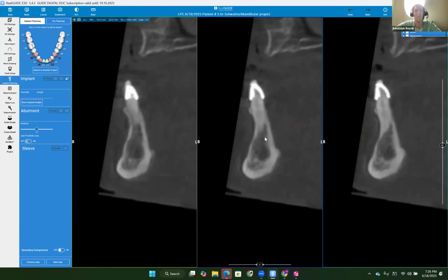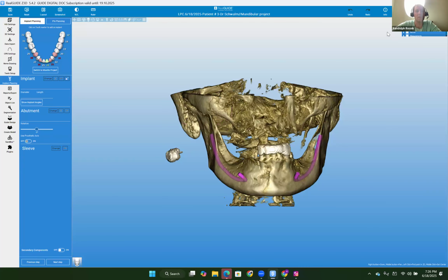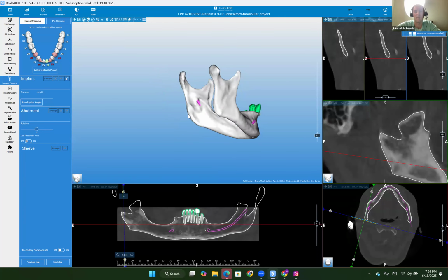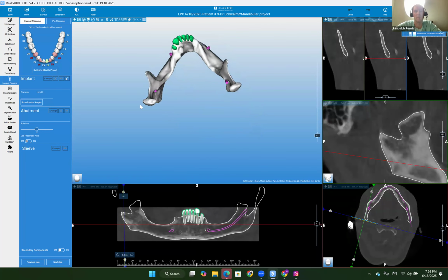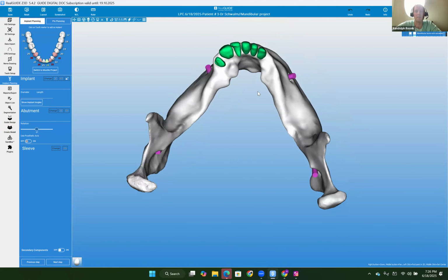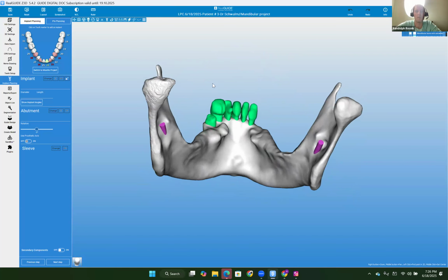Yes. So Hussein, let's look at the 3D view, looking at it from the occlusal aspect, just to show the morphology of the ridge there. So let's start right there. Here we go, and then just turn that, perfect right there, and then go from the occlusal. So you can appreciate how significant that lingual undercut is there in the posterior. That's a pretty wicked lingual undercut.